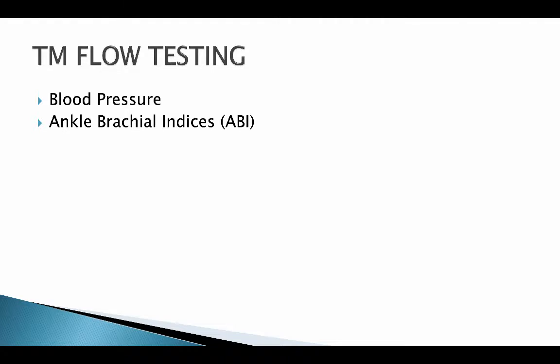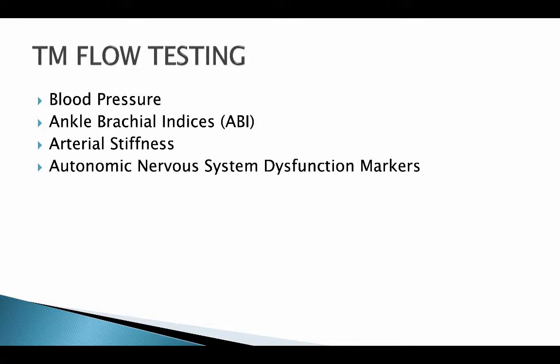is compared to the upper extremity pressure as a marker for peripheral vascular disease, arterial stiffness, autonomic nervous system dysfunction, and sudomotor testing of the soles of the feet. And by using all these results, the TM Flow will come up with a wellness program individualized to the patient.